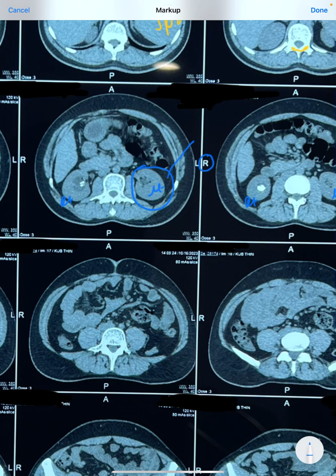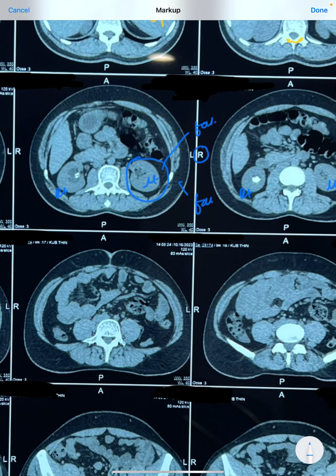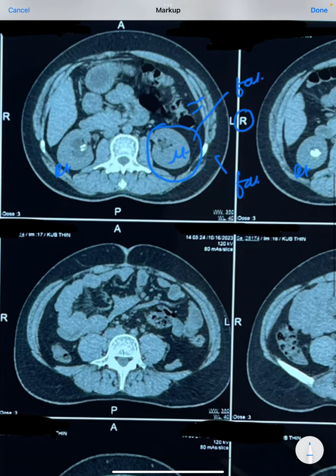Now this is all fat, this blackish structure is all fat. So this is the blackishness, or the radiolucency, of the fat, and the kidney is pretty well placed in this fat. So if there is any inflammation, there will be fat stranding, or very thin fibrous bands or streaks of whitishness can be seen in the fat, but here it is not at all there.